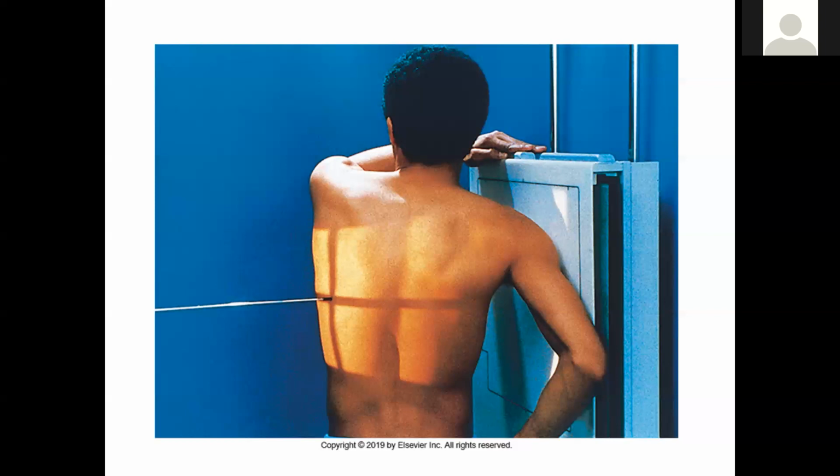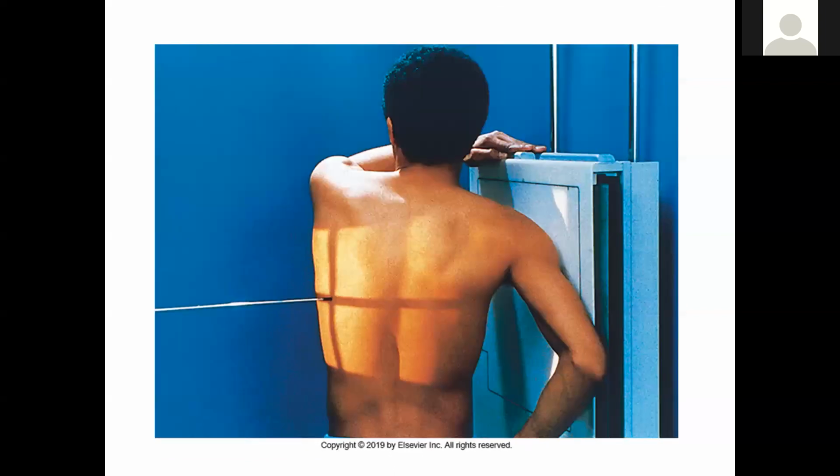So if we are looking at the left side of this patient in an LPO position, we're elongating the left side. We turn them around. Now the left side is pulled away. It will also be elongated. So the AP and PA obliques are opposite each other. If you just memorize one set, which way you roll them, which way it'll elongate, then you can just reverse it. So an LPO and RAO will have the same rotational effect on your patient.